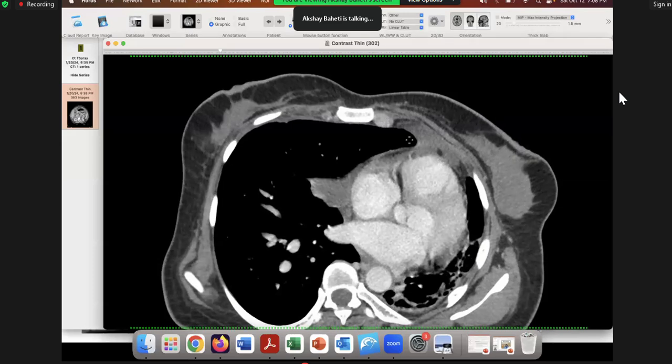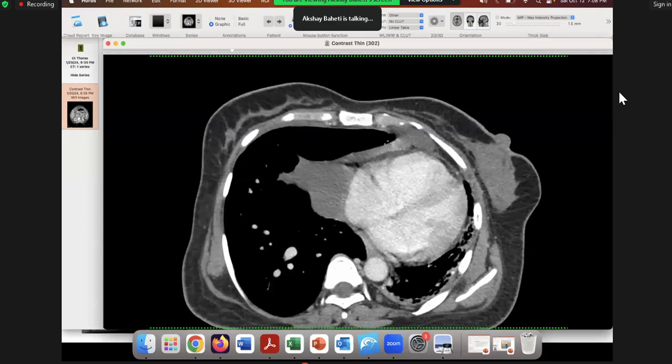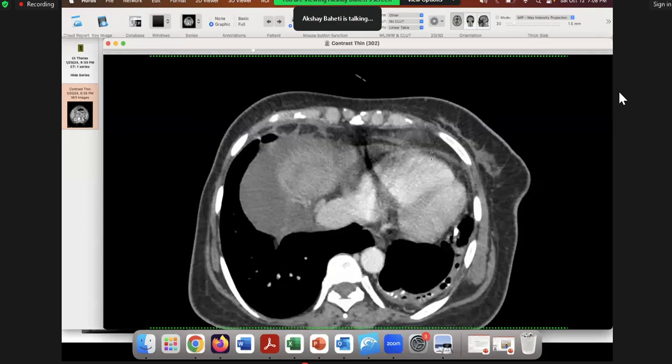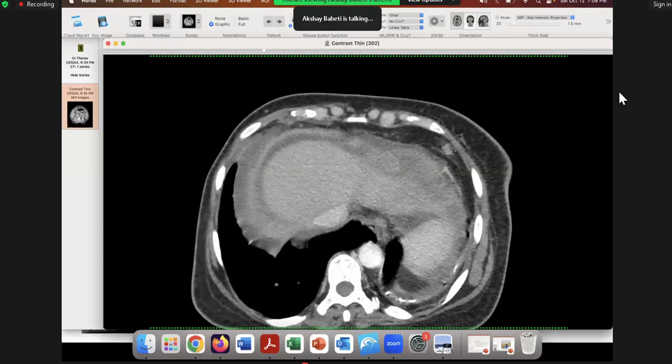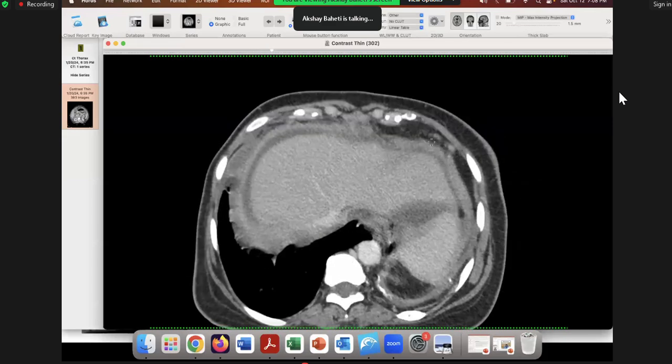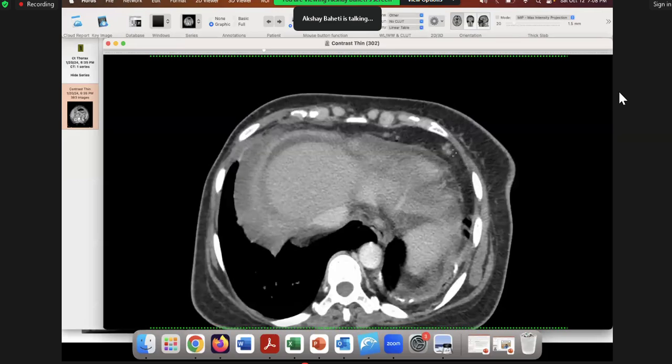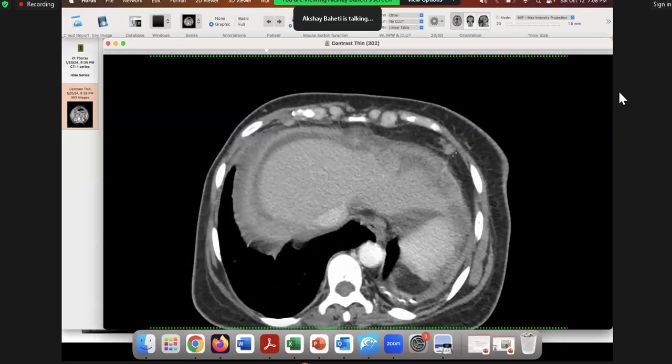Okay, so I still don't know. Supraclav is indeterminate. I'm not saying that it's metastatic. This one certainly looks metastatic. Okay, then the other thing is going to be epicardiac or epiphrenic nodes. Okay, so normally you would see some smallish nodes often. So this one I'm not that worried. They are small, sub-centimeter sized. Okay, but sometimes they can sort of be big.